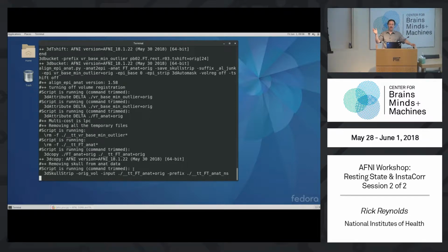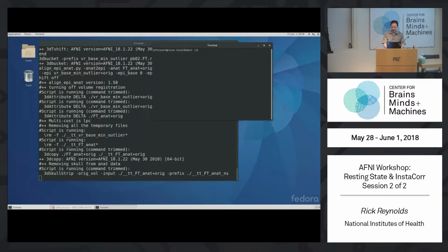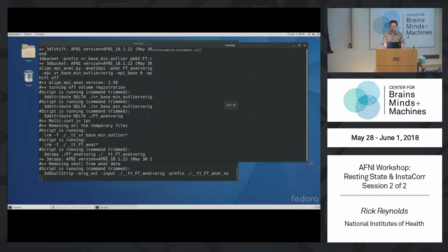You can do that with bash too, and you can see the afni_proc help for the syntax, or you can give a -bash option to afni_proc and it will tell you how to do it. Let's let that do its thing for a while, and now let's go do some Insta stuff.